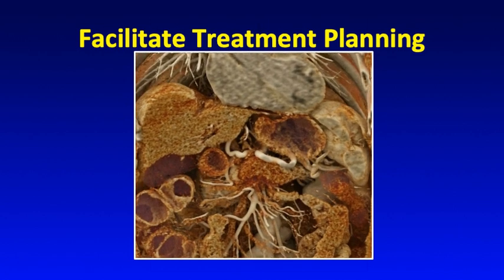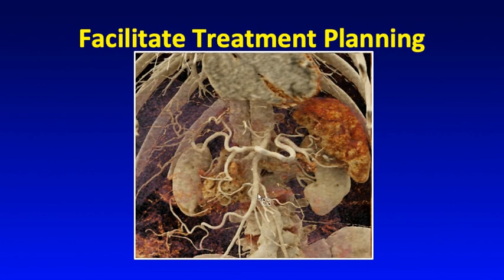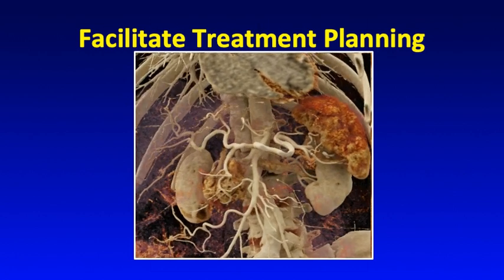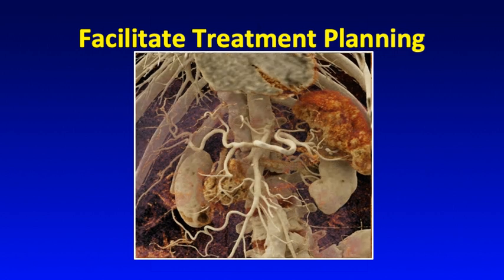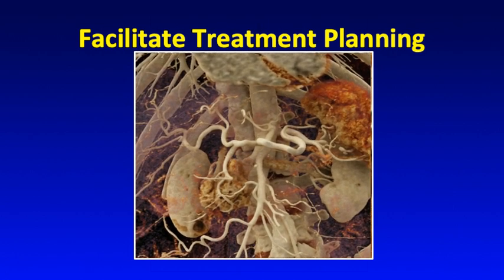And we can also fade away the pancreatic tumor and then focus on the vascular map, so the surgeons can now focus their attention on the vascular reconstruction options. And as I have shown before, the tumor encases the celiac artery and the common hepatic artery and splenic artery, and now they can really get a sense of what they need to do to take out this tumor.